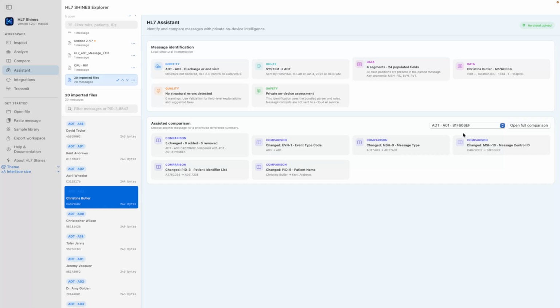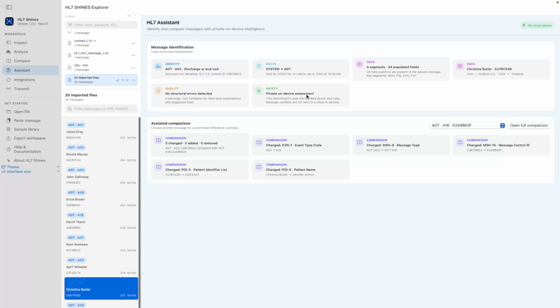Again, you can select different messages over here to get the details. So a lot of powerful options. Maybe in one video I cannot explain. You can download this and start using it. And we have both Windows and MacBook versions as well.